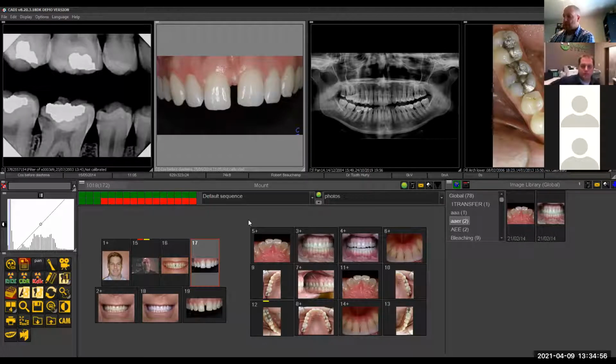Yeah. With the Polaroid software, we have the ability to interface with the Wi-Fi communication of these digital SLRs as well. It is a little bit of a delayed reaction the way it gets in. Most offices like to create a protocol when you're looking at the day in, day out routine. The way that we worked with this, we worked with LVI at the time, and then another group here, the Fortune practice. But the way it works with the software is there's an import icon.